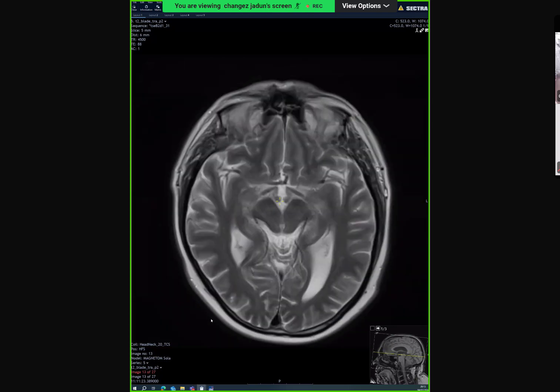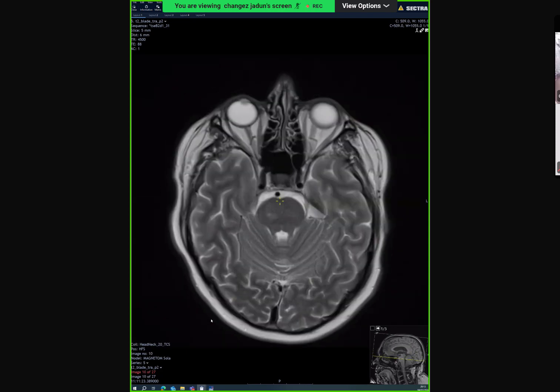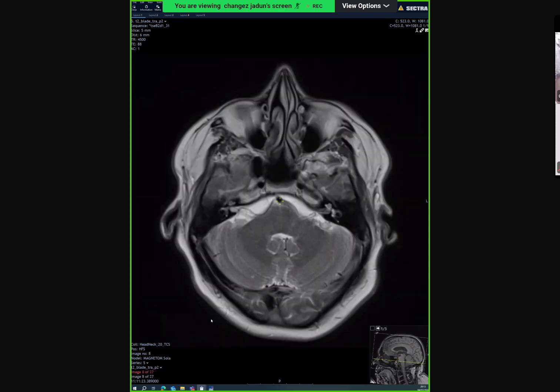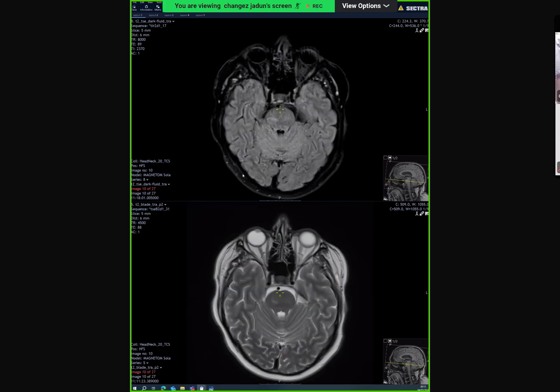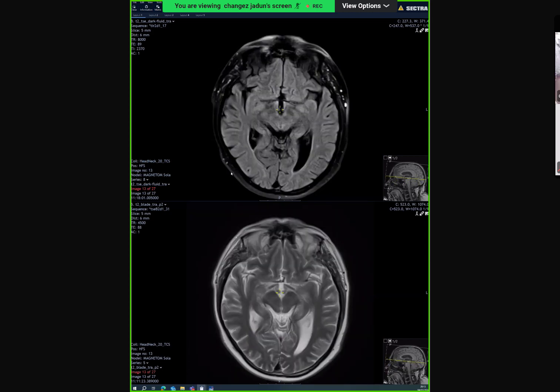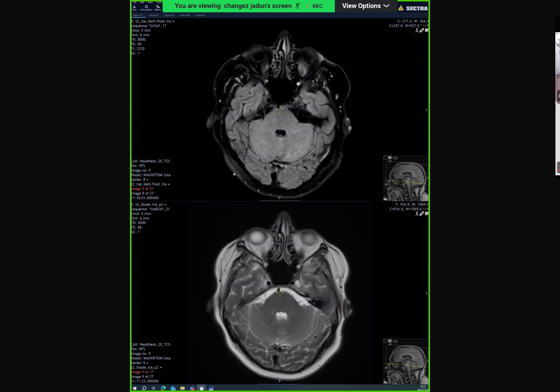Well, I'm concerned about venous sinus thrombosis. On FLAIR, can we go down to the pons more? On FLAIR, I suspected a hyperintense signal at the right hemipons. It might be an old ischemic insult. I would ascertain from the DWI as well if it is restricting or not. No associated mass effect. Major flow voids seem to be preserved.